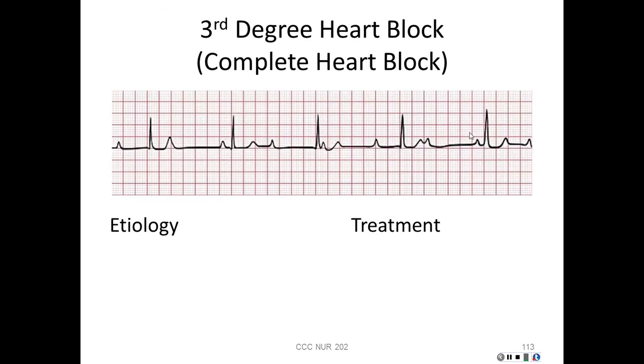Okay, again, another one. If you look, here's a P wave. If you look at this T wave, notice that it's taller than these T waves. You actually have a P wave hidden in here. You have a P wave, a P wave, another P wave, here, and here. If you march those out, you would see they're regular.